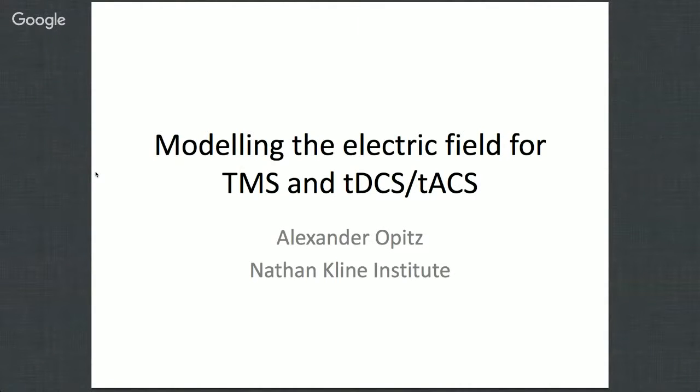So I'm gonna talk about modeling the electric field for TMS and TDCS. I'll try to only give a very short introduction to what those methods are, and then show you some demos of our software. We just set it up on this laptop literally half an hour before the talk, so I hope everything will work.